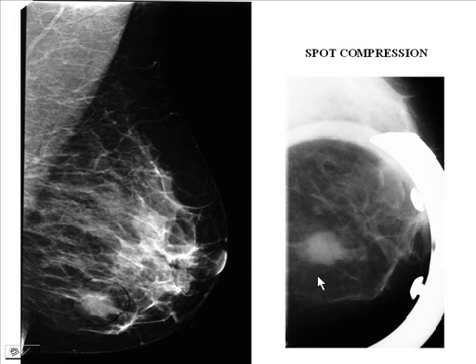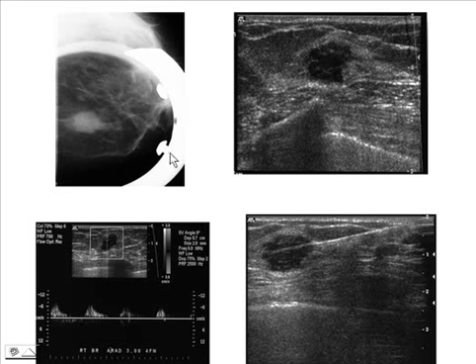Is it a cyst? Is it solid? Is it normal breast tissue? Here's that spot compression view. The ultrasound actually shows it a whole lot better. You can see it in relief against the normal breast tissue that surrounds it. You can see a lot more of the margins, which are spiculated and angulated. You can see a lot more about the contents. This is not a cystic mass, but it's very hypoechoic compared to the surrounding fat. And this has very suspicious characteristics.